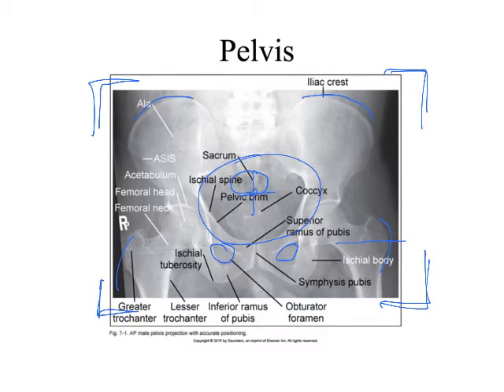I'm going to draw a really terrible picture. Profile. I always think about Alfred Hitchcock. Do y'all remember that TV show? I used to grow up watching Nickelodeon. It always began with him showing his profile, right? He had a very distinct profile. The greater trochanters have a very distinct profile. So if I see the greater trochanters in profile on this image, I know that the patient's feet were appropriately rotated inward, right? So that I can see that anatomy.